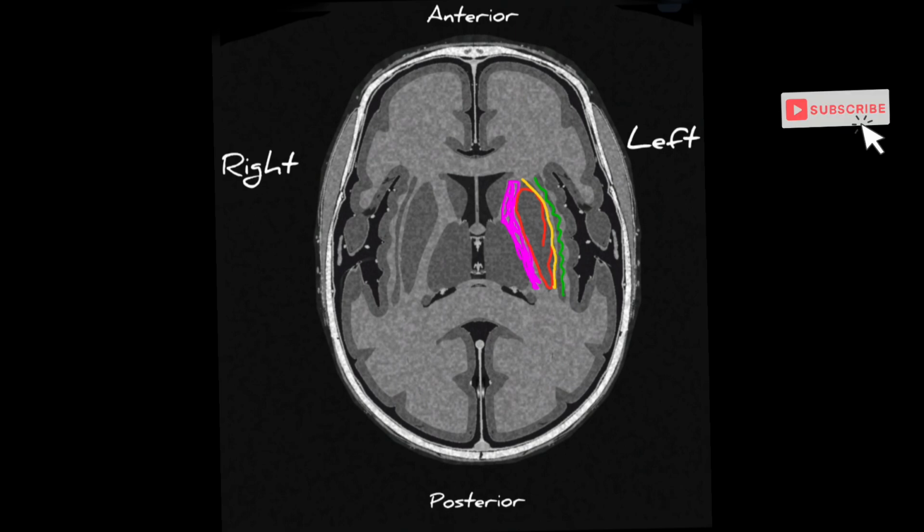Just posterior to the third ventricle, there is the area of the pineal gland, and laterally there is a small projection seen, a white projection, that is called the choroid plexus. And again on both sides the small black shadows are called the atrium. And downward towards the posterior side there is a projection, that is the falx cerebri, and that is the part of the superior sagittal sinus.